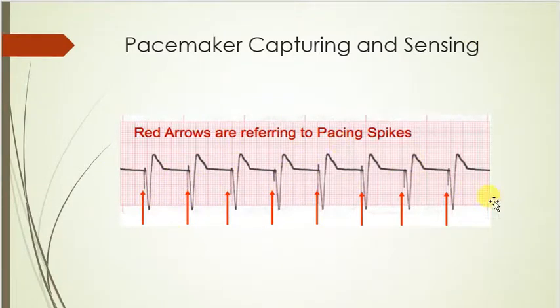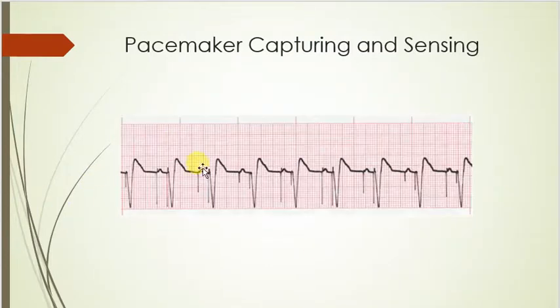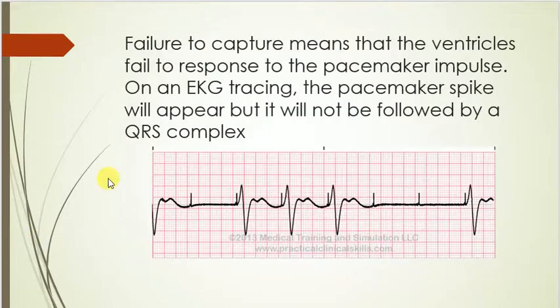It's initiating a heartbeat every time, and that's a really pretty paced rhythm. Here's another one, but this is like a dual pacemaker. See how it's pacing the atria and it's pacing the ventricle? You have two spikes here. Okay, so that's a dual pacemaker.